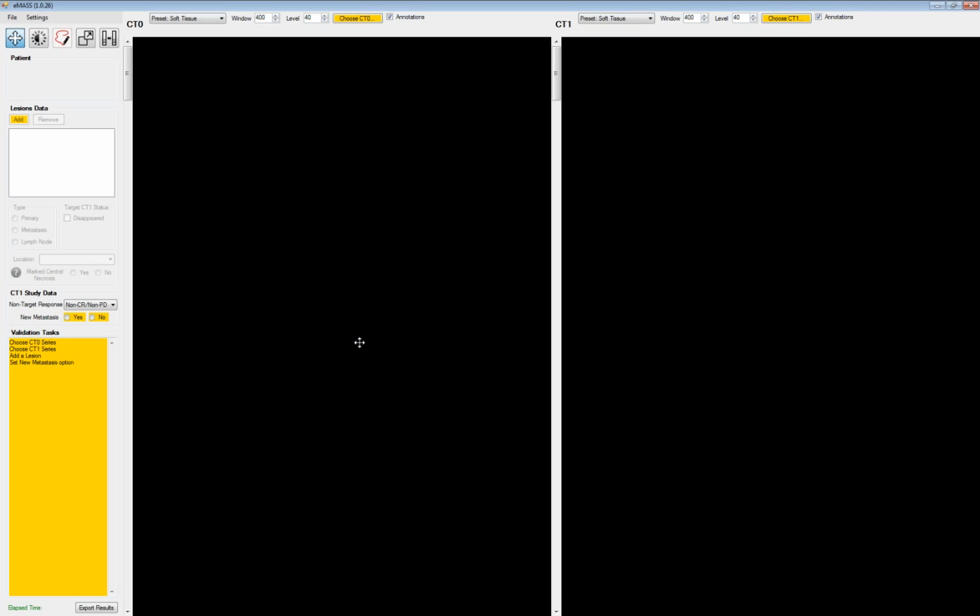All right, I like it. Sounds good. Well, bear with me, everyone. We're going to show the nitty-gritty and the details of this because it is fairly fast, and we have time to do that. So this is the overall display here. We're going to go ahead and load up a case.